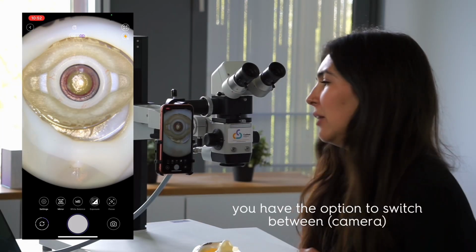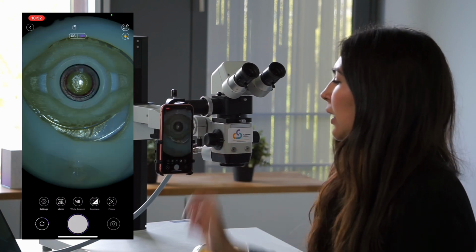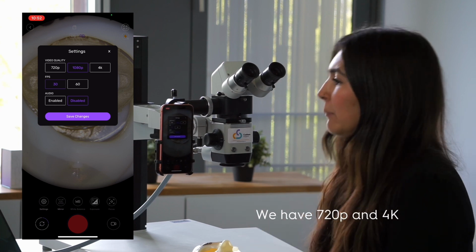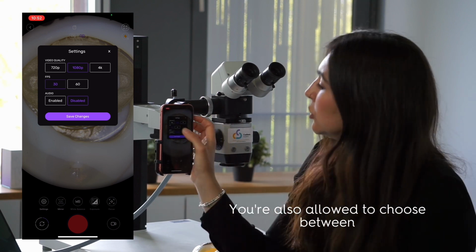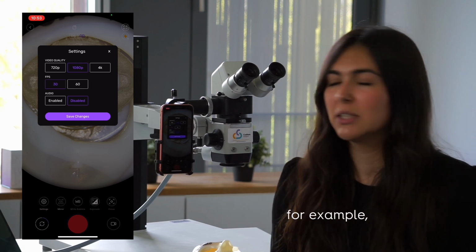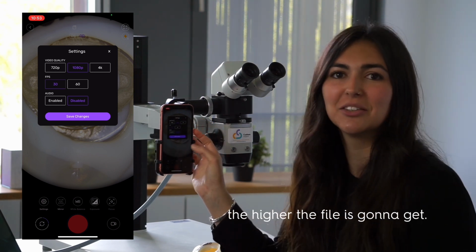So with the MicroREC app, you have the option to switch between camera or picture mode and video mode. So basically, clicking here, you can switch between both. And in the video mode, you can select which video quality you want to record with. So we have 720, 1080, and 4K. And different FPS, so frames per second, 30 or 60. You're also allowed to choose between audio enable or disable, depending on what you prefer. If you want to be talking during the recording and you want to save things for your students, for example, you can also do that. So the video quality, you can choose whatever you want. Just keep in mind, the higher the video quality, the higher the file it's gonna get.